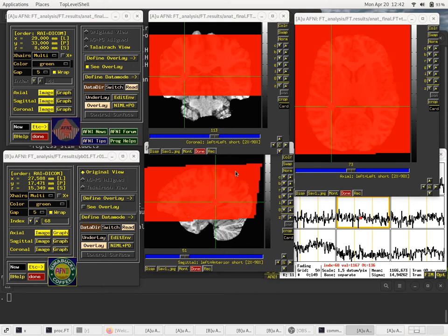And what you can see right here in the sagittal image is it's no longer just a shoebox. The top and the bottom slices look basically parallel here. That's great. That would qualify as a shoebox sitting in standard space, but left and right is not parallel. This could be truncated, but this is no longer a right angle. That's a little acute, and this is more obtuse down on the bottom.